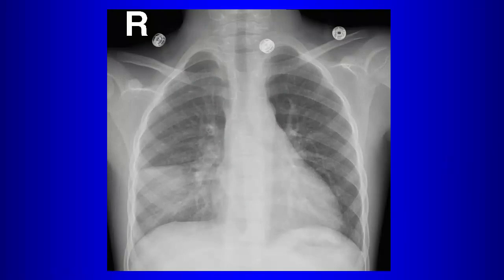What about this case? Right lower lobe opacity/consolidation. Tell me what you think this is. Your diagnosis would be what? Pneumonia. Yeah, pneumonia, right. Where? Right lower lobe. Why do you say right lower? Sorry, no, right middle. Okay.